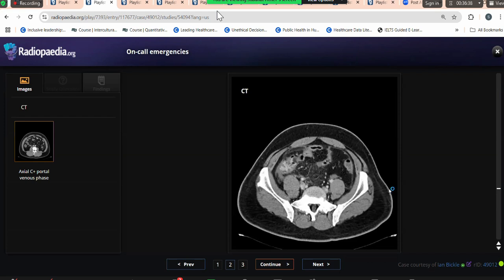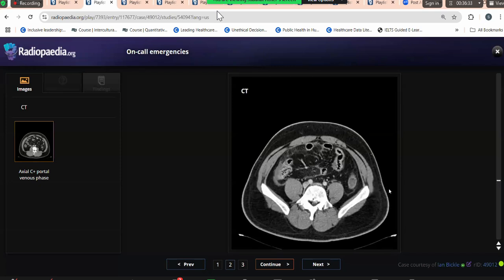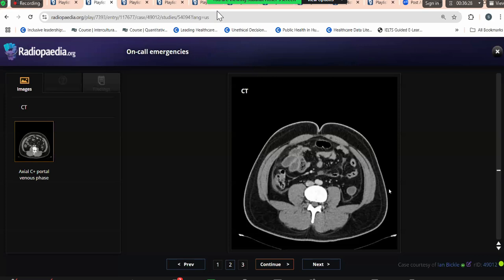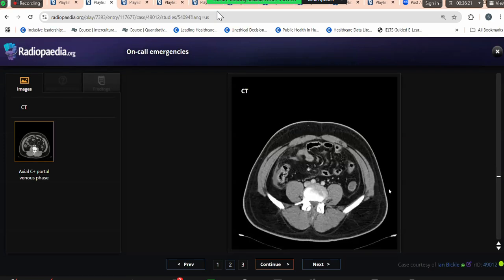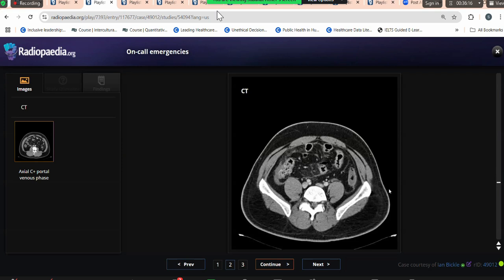that also appears thick walled and with a streak of fluid, and the ascending colon apart from the cecum does not show any wall thickening or any mass. I would be looking at the region of the terminal ileum. In conclusion, candidate 3? My primary differential in this case is inflammatory etiology with acute appendicitis that has involved the cecum with inflammatory changes in the cecum.